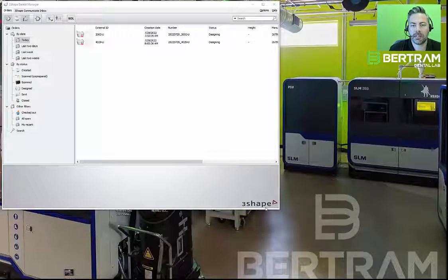Let's start a new case today. We're going to do an upper locator case. So I'm just going to run through this order entry quick for you.